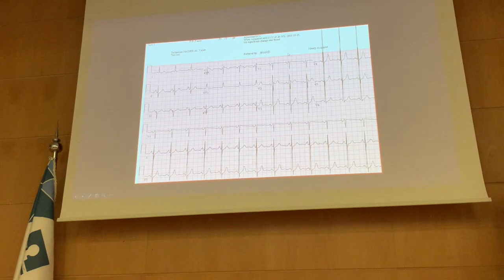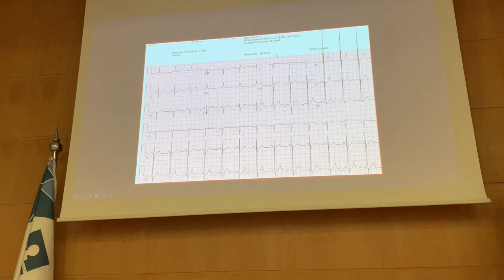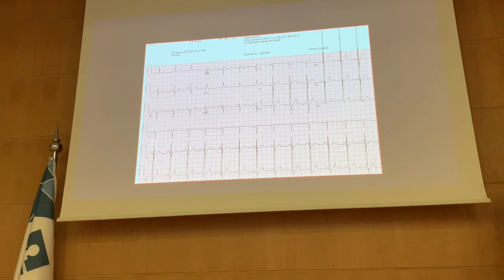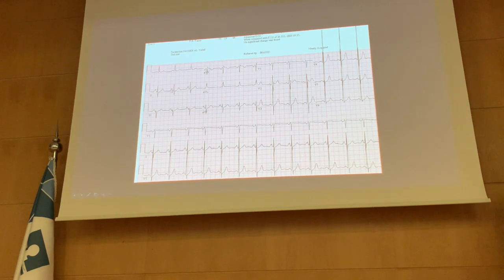This patient also. Yalla. So what do you think about the P wave here? It's too much of a P wave. We said the P wave must be small, tiny. So this is more than that. If you just calculate it, it must not exceed 2.5 millimeters. They are 2 and a half small squares. So it's big, so right? Okay. This can be big and can be right.